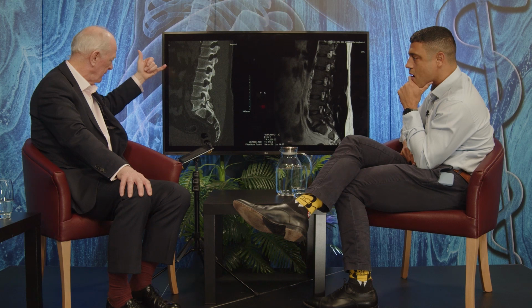And in this case, I mean, that is a very, very clear image of a pars defect, though, isn't it? Yeah. There's a big lump sticking out, independent of everything else. And I should just point out that we're looking here at L5S1 there, aren't we? Yes. And while you were pointing, this was full screen, so the audience couldn't see you pointing.